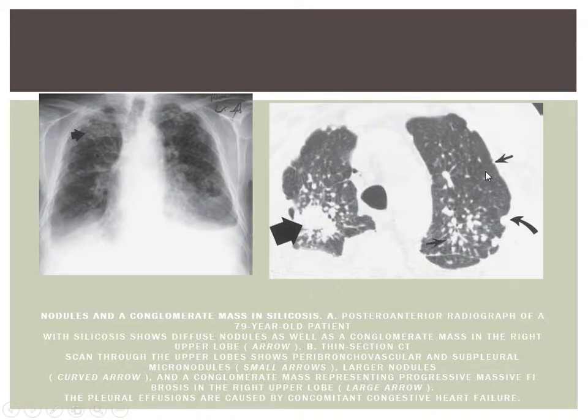Now, there are other multiple nodules, these peripheral nodules on the left side, which will mature into PMF later.